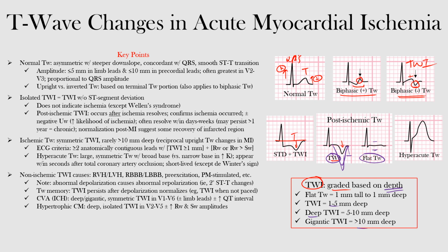So what about isolated T-wave inversion? That is T-wave inversion without concomitant ST elevation or depression. So we only have isolated T-wave changes that are inverted, and there's no ST segment deviation.